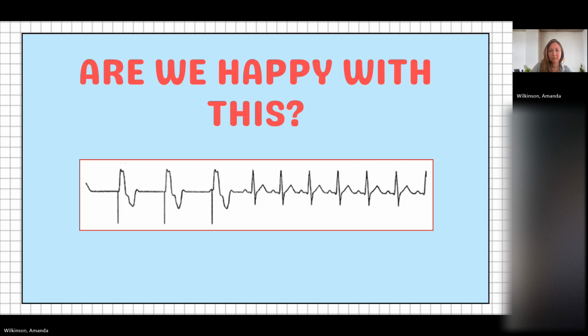I think when the patient's own rhythm picks up, the pacemaker is probably set not to pace when the patient's own pacer is picked up.